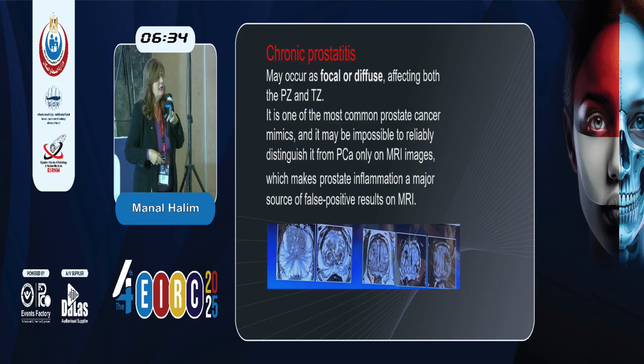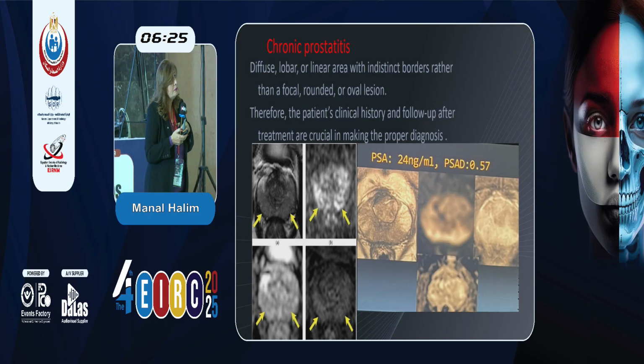This is prostatitis, linear, radial. This is another prostatitis. This is another focal prostatitis. All say the same, looks the same.